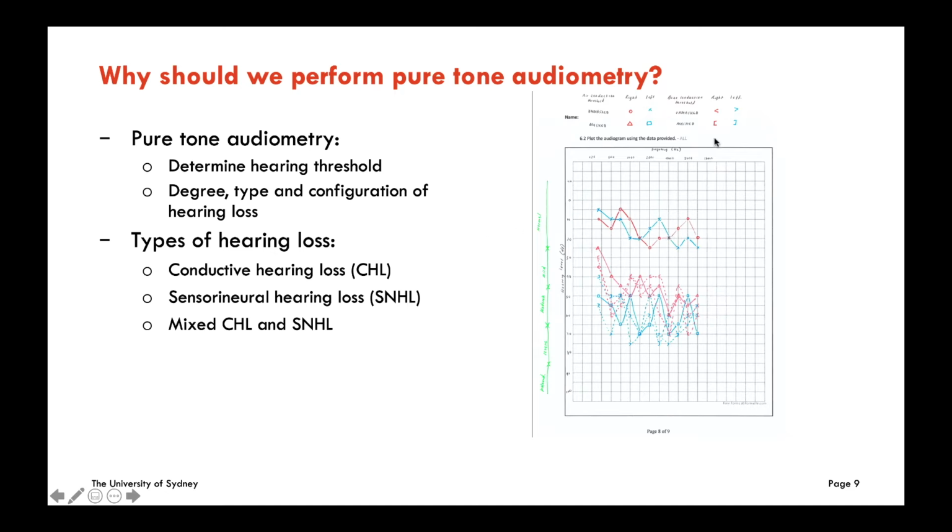And looking at the left ear, again, if you do the same masking on the left ear, which is shown as the blue rectangles, we can see the hearing threshold is also decreasing on the left ear, starting from 50 decibels to a lower limit of 75 decibels.